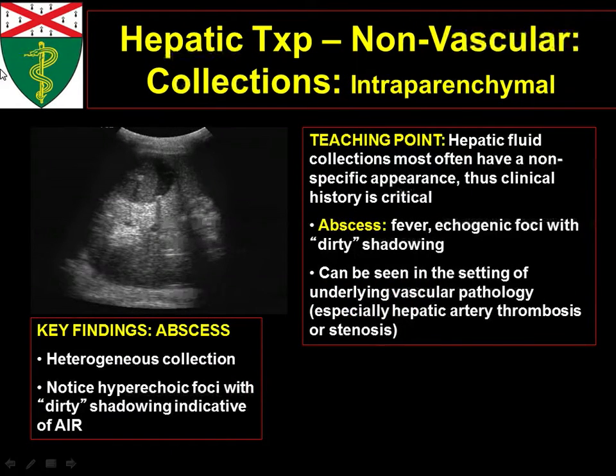So this is another abscess over here, right? Another heterogeneous collection, foci of air within it. And that kind of looks like an abscess. And the thing with abscesses, and we'll get to it in one of our cases, is whenever you see a liver abscess in a transplanted patient, make sure you interrogate the vessels.